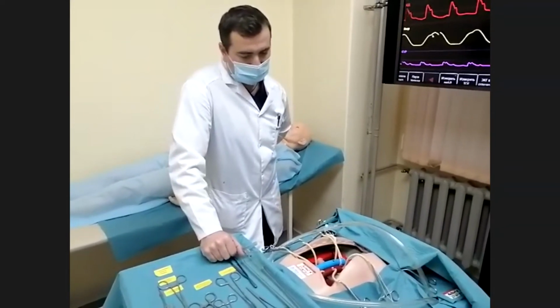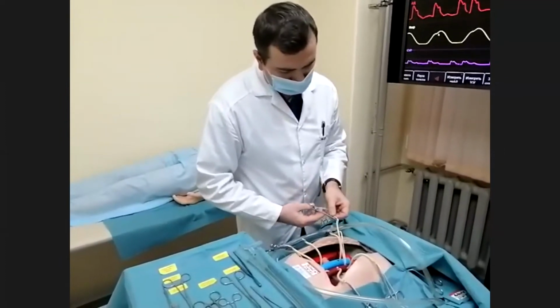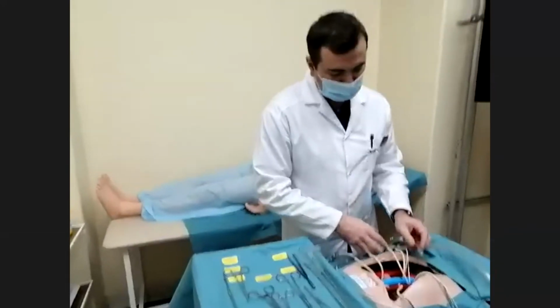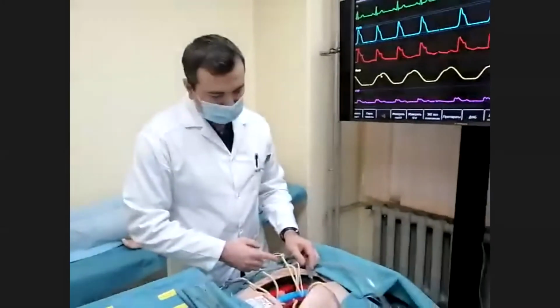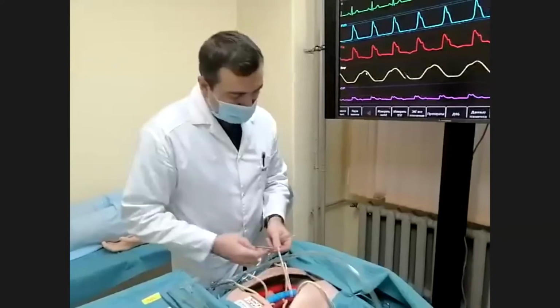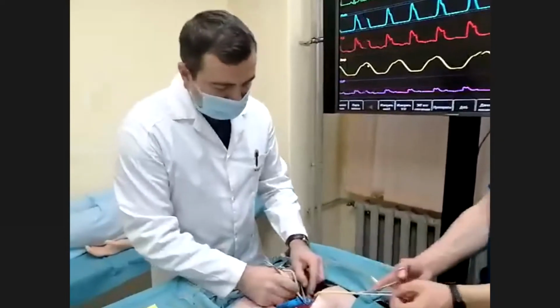My next question regarding the tubes and the holes in the tubes. Why did you decide to make the hole? Why didn't you cut the tube every time? For me, it's not too difficult to replace tubes after, I would say, 1 procedure, probably 2 or 3. Why did you decide to use the holes? Because this simulator is not for learning the technique of cannulation. It's not important for this situation.